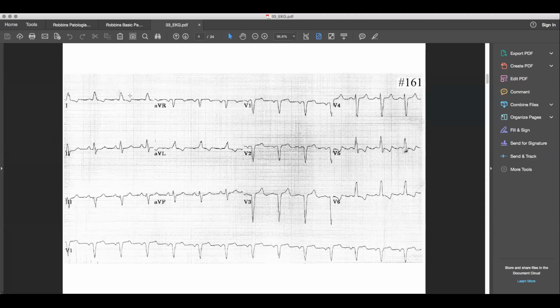For the electrical axis, we can see that lead 1 is positive, AVF is negative mostly, indicating left axis deviation. In case of lead 2 being slightly more positive and the closest to equiphasic, I would say that the electrical axis is between -20 and -15 degrees.